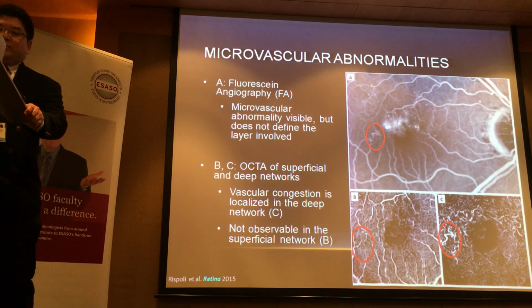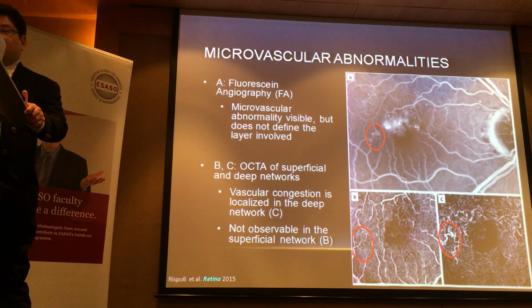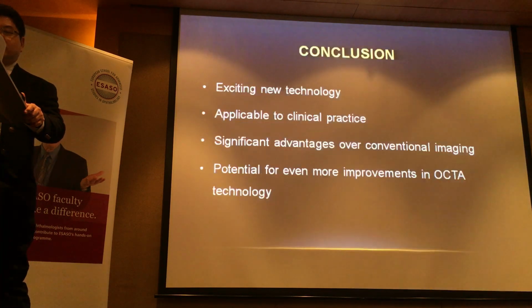So again, what's been described will be areas of dropout, and areas of even the microvascular abnormalities of RVO.